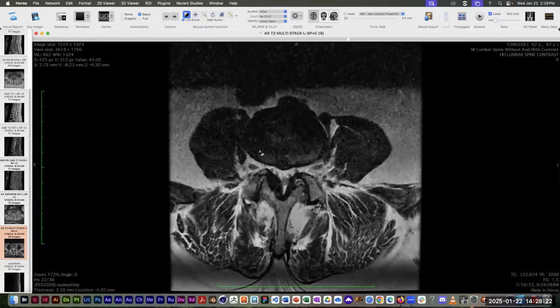All right, so that oval thing kind of near the top of the image, that's either part of the vertebra or part of the intervertebral disc. Any guesses what these other black blobs are immediately on either side of the lumbar vertebrae? Nope, that's adjacent to the body.